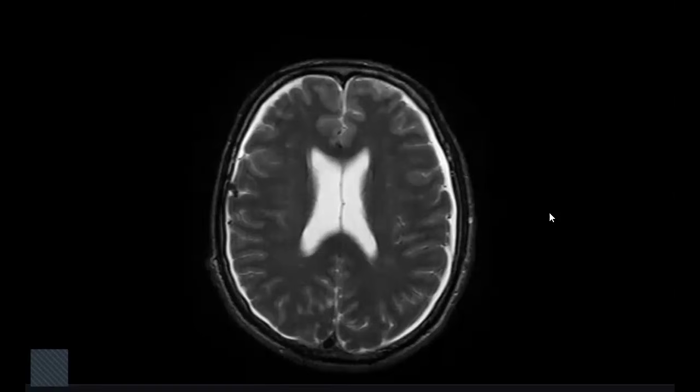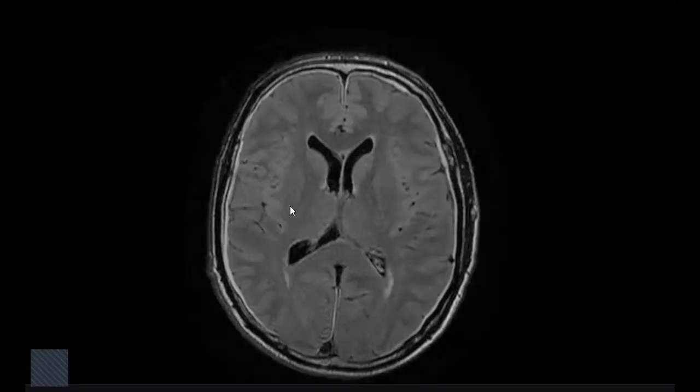Okay, what are the other features of this case you are looking for, other than pachymeningeal enhancement? Yes, I would look for the pituitary gland. What will be the abnormality in the pituitary gland? In the pituitary gland, there would be hyperemia, and also I would see the venous sinuses would be slightly enlarged compared to the normal. And also in the sagittal view, maybe sagging of the corpus callosum and herniation.